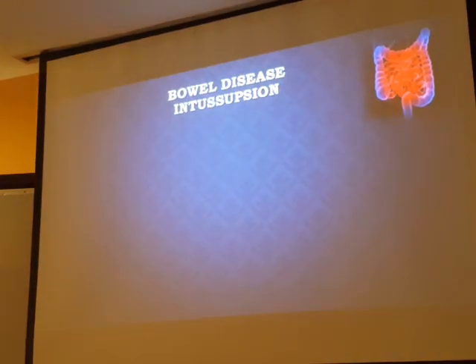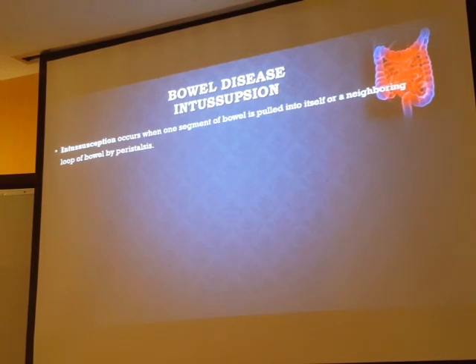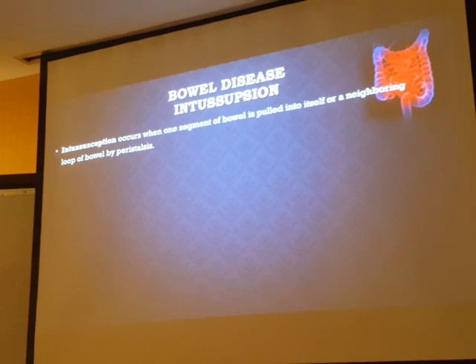Now let's go to the intussusception. Intussusception, what is it? It is when one loop of the bowel goes inside the other loop. It's a very sad case, a very urgent case. You have to respond. The doctor has to respond.